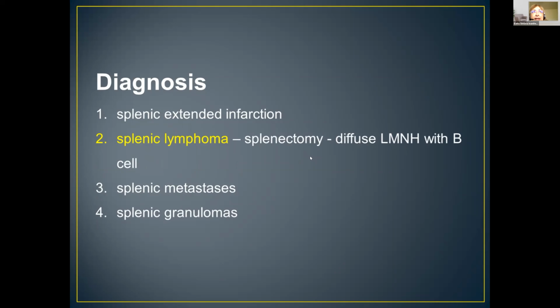What can I say? Counting only the serious images, the diagnosis of granuloma could be possible.